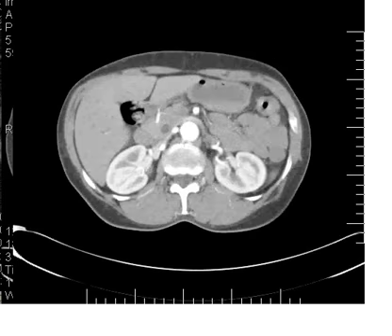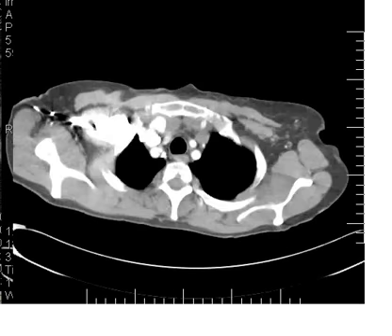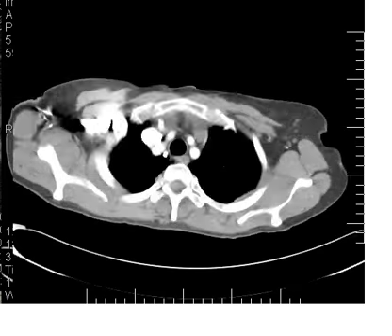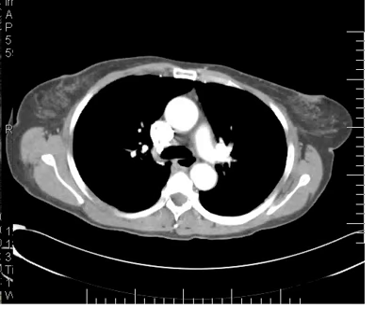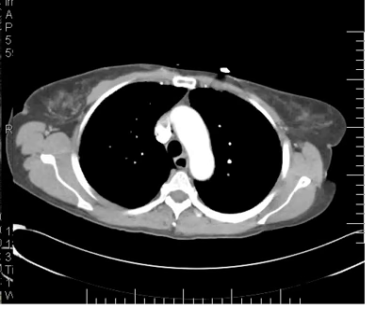Okay. Now, in terms of getting your bearings on these scans, I think the best place to start is at the aortic arch, and that's something that we can all find pretty readily. So here's the aortic arch right here. Okay, you have the trachea and the esophagus, and here you have the superior vena cava.